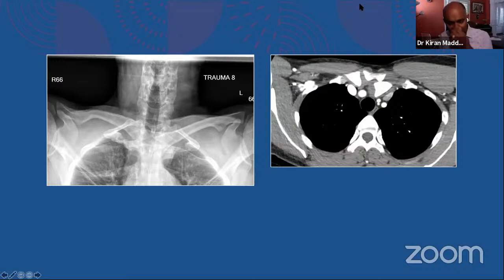If any of you want to become a good radiologist, one thing is comparing both sides. Comparing both sides. I'm trying to show you some bones. I already gave you the clue, it is about bones. So I narrowed down the differential for you. Any bone, even if you mistake the site of the injury, like a right to left goof, very good.